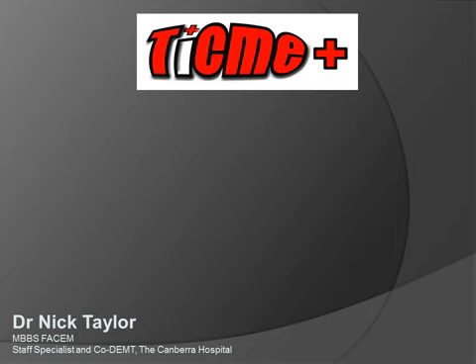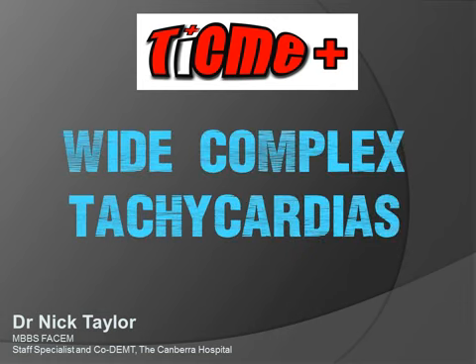Today's session is one of the TiCME Plus tutorials, so slightly more advanced content, and it's all about wide complex tachycardias. This pairs with the narrow complex tachycardia talk. Remember, if at any stage you want more time to look at any ECGs, just press pause on the movie.